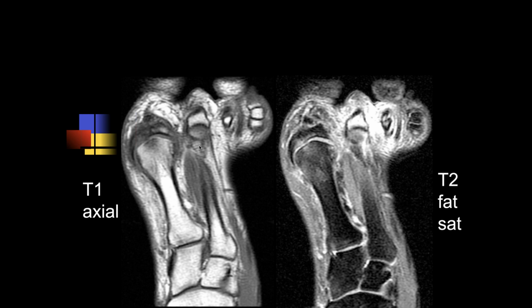Okay, so what do you think's going on here? Are there not more images? This is a common finding in foot imaging. But just based upon these images, what would you call this? Well, like I said, there are pretty marked degenerative changes at the first MTP joint. Okay, I'll give you the first MTP joint. What about the rest of the findings you described? What are they caused by?